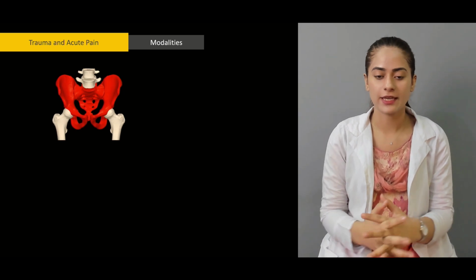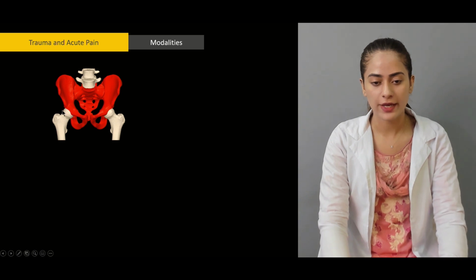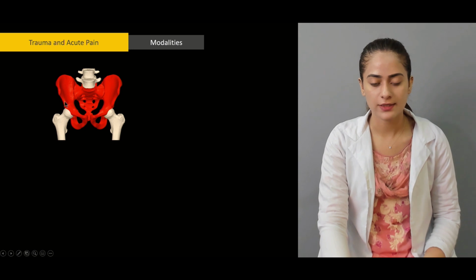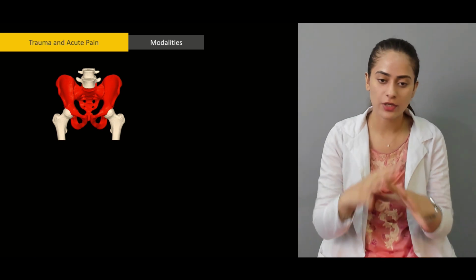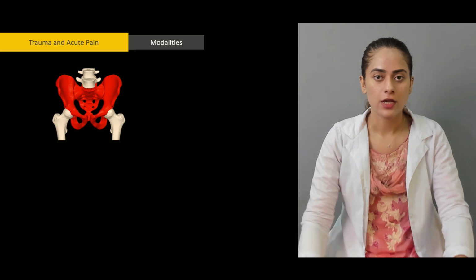So this is a pelvis. First let's talk about this. This is the pelvis bone, and this is the femur. This is the head and the acetabulum. This is the pubis, ilium, and this is the ischium, right? This is the sacral spine and the iliosacral joint. We're going to repeat this again and again on radiographs, and it'll be clear how everything appears and is seen on a radiograph. We're going to label them again and again so everybody will understand.